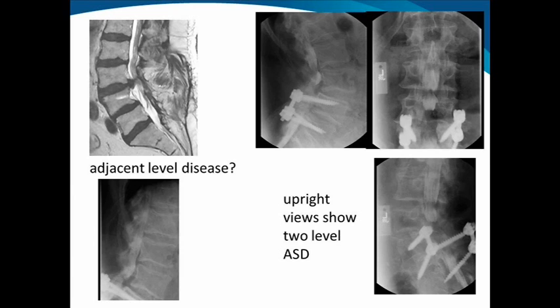A couple more examples of myelographic findings. Here we're seeing adjacent level disease at the L3-4 level where the patient is instrumented with pedicle screws at L4 and L5. The proximal, the first adjacent level at L3-4, has a large disc herniation. The surgeon wanted to evaluate how significant this disc herniation is with respect to flow of CSF across the cauda equina. Top right image and the bottom right image shows you a complete myelographic block when the patient stands at this level.